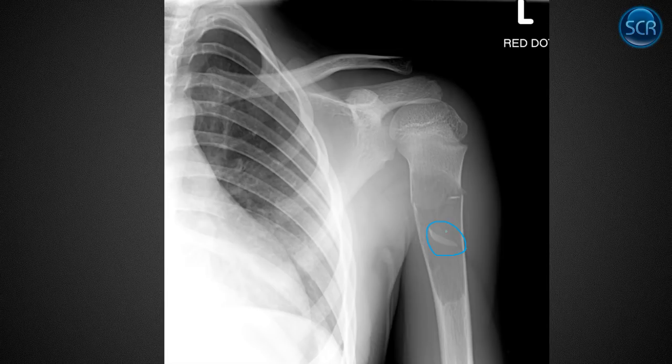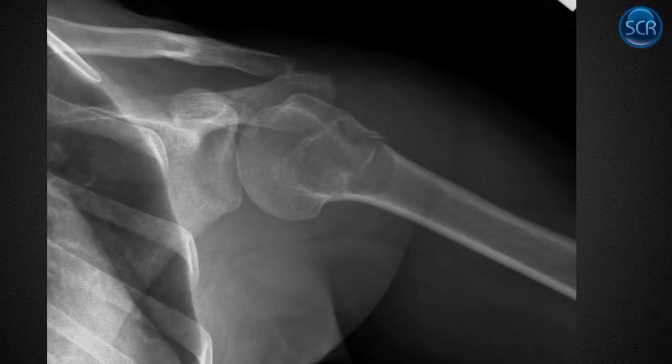So if there was tissue in here, these fragments couldn't fall into the chamber of the cyst. But it's a cyst, so they can. And so this is a simple bone cyst. It's a classic example. Here's another one, right? Well-defined lesion, proximal humerus, young person. These are all classic things for simple bone cyst.